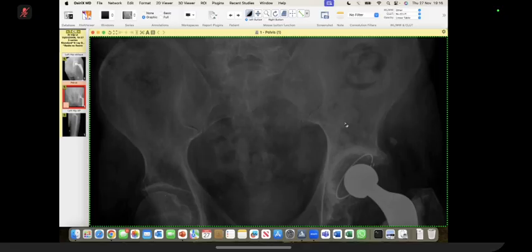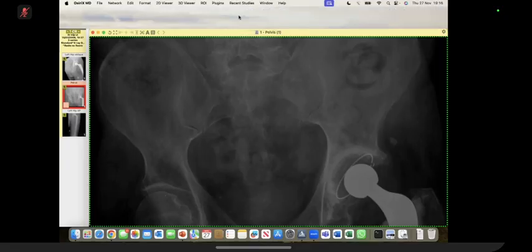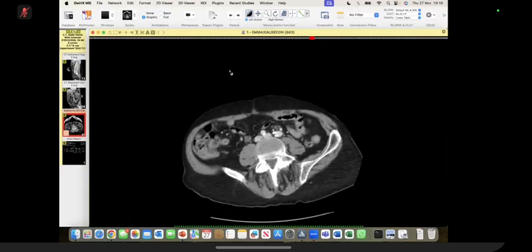Which modality do you want to see now? Sir, MRI. The patient cannot have an MR. Okay, sir, then CT. Yes, sir. So CT scan with contrast. What is the role of contrast? To see any enhancement pattern inside the tumor, and aggressiveness of the tumor. Will bone lesions enhance on CT? If they have a soft tissue component, then they may show enhancement.